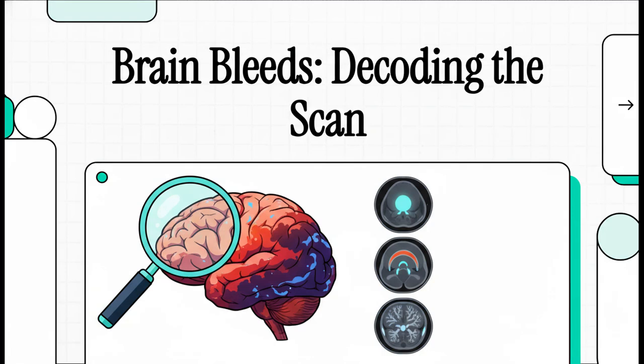All right, welcome. Today, we are diving headfirst into the fascinating world of neuroradiology. We're going to learn how to decode the different types of brain hemorrhages you might see on a scan to really understand the story that image is telling.